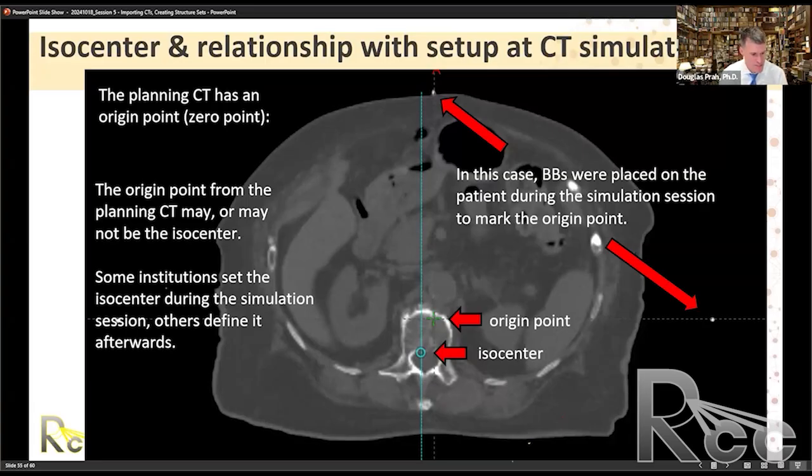So I might put the isocenter in between two vertebral bodies, and then I'll treat one superior so that in the future, if I have to come back and treat the inferior one, I don't have to accidentally worry about treating the cord too much with the diverging beams. So there's some logic that can be used in identifying where I put these isocenters.